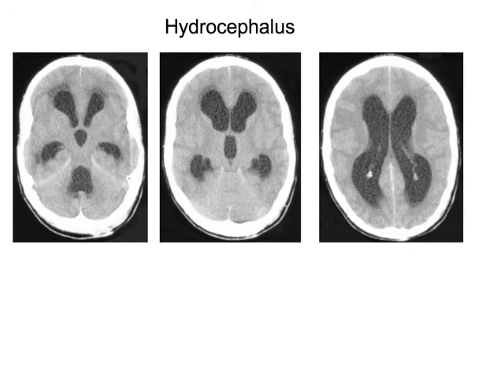All right, so here's a clear case of hydrocephalus. We just see enlarged ventricles, and the choroid plexus here within the ventricles is pumping out all that CSF, but it doesn't have any place to go because perhaps an infectious process or something else has backed up the CSF, and it's now creating a tremendous amount of pressure within the ventricles. This is a common appearance of hydrocephalus.